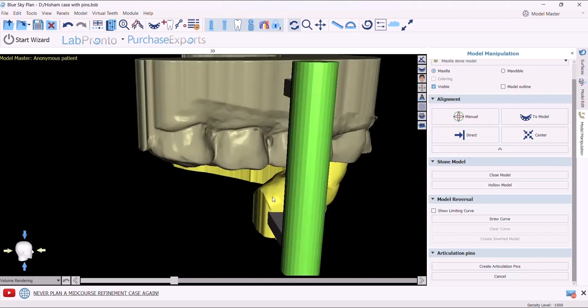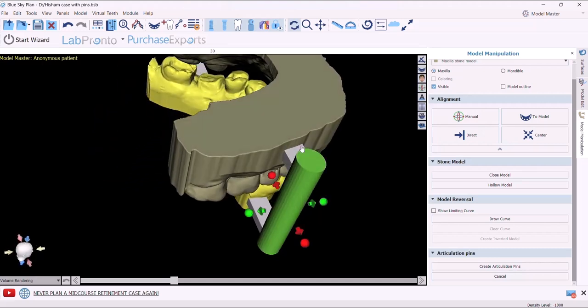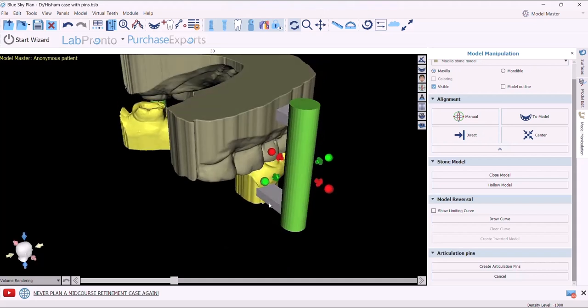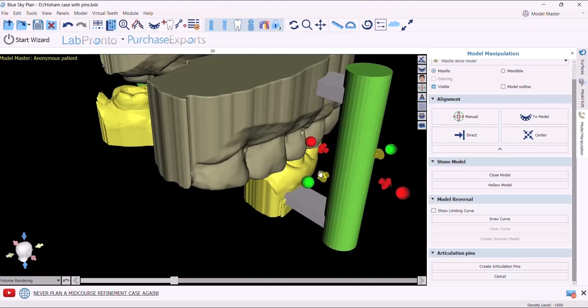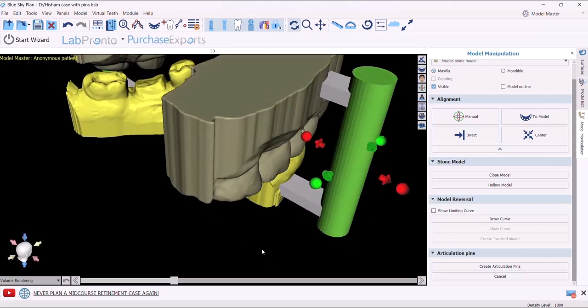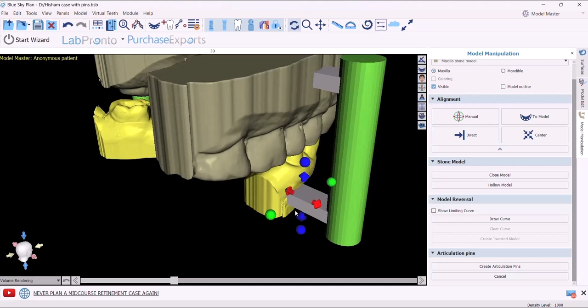The most important point is to notice that the bars are fully joined to the cast. So this upper one, it's okay, but the problem is in the lower. As you can see, it's a bit off. So we move the pin and the bar slightly anteriorly until it's okay. The same bar, I could reduce its thickness, move it up and down, or sideways.